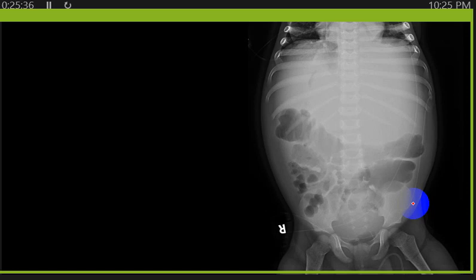Okay. What is your recommendation? I recommend to know the history of the patient, the age, and the next step is axial CT scan. Ultrasound, then CT scan. Okay. We have a CT scan.